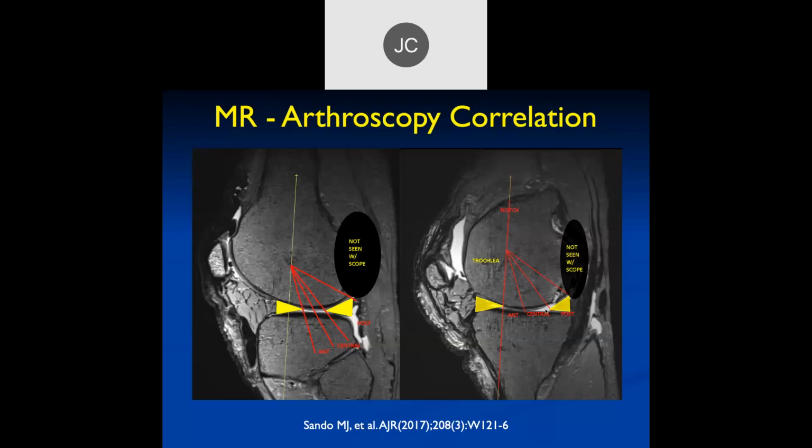And therefore, that was the reason why we had a big discrepancy. In fact, the bulk of the articular cartilage, especially of the posterior knee, was not evaluated at all by standard arthroscopy, even when you have the ideal situation where you're dealing with a disarticulated knee rather than a full patient. And what we called posterior part of the joint space is back here where the arthroscopist couldn't visualize the articular cartilage. What the arthroscopist called the posterior part of the knee was basically that part of the articular cartilage which was adjacent to the posterior horn of the meniscus.